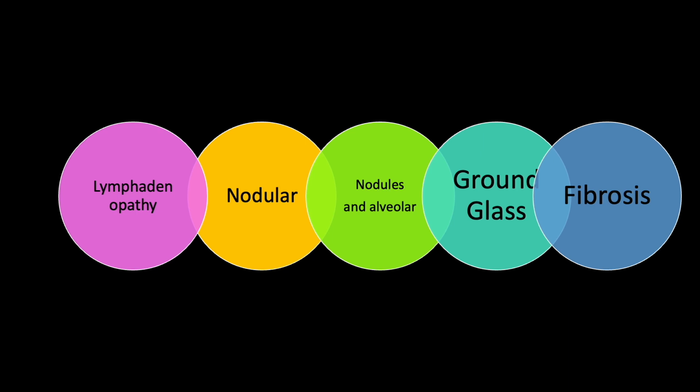A lot of times you would also see nodules along with consolidations, with masses, with certain alveolar shadows, or irregular shaped nodules. That is another scenario where we could suspect sarcoid. The other thing is ground glass opacification in the lung, and in complicated stages, in stages of advanced sarcoidosis, fibrosis or scarring or fibrocystic appearances may also be seen, but this is more in the last stages of sarcoidosis.